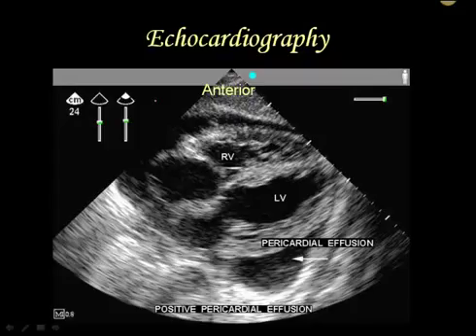Notice in X-ray, we don't really have a way of differentiating that. So the presence or absence of fluid also kind of bounces back. As you can see here, this is roughly speaking a long axis view where you've got the septa right here to here. So we've got the right atrium, the left atrium. You can see where the right ventricle and left ventricle are. This is all myocardium. And unfortunately, there's this big old bunch of fluid that's kind of settling down in there.